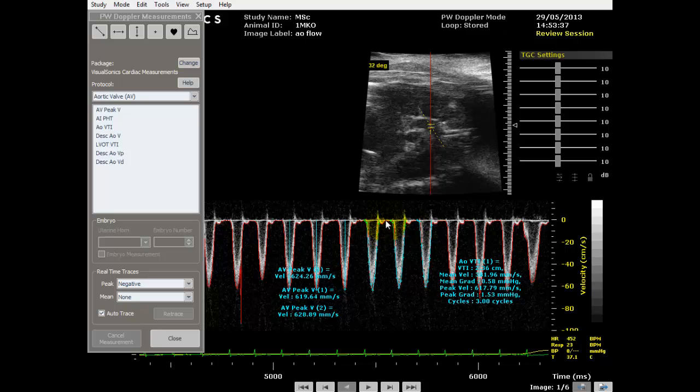You'll notice I didn't include these little shoulders in the analysis. There's no real need to. To be honest, if you do include them, it makes very little difference to your data, because the percentage of this to the rest of it is tiny. But to be complete, you don't want to include the shoulder, so when you're clicking, click at the start of this one and right at the end before the shoulder. That's when the aortic valve is just shut and there's a little bit of turbulence within the aorta there.